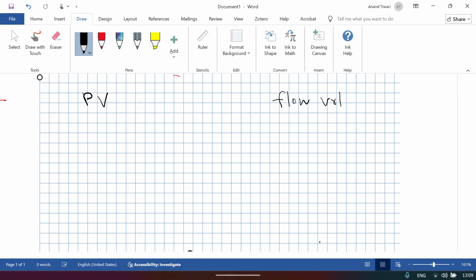Now in the pressure-volume loop, volume is on the y-axis and pressure on the x-axis. Anything which you see here, if you see a sharp fin appearance, or you see that there is a clockwise motion, it is related to spontaneous breathing effort. What I mean is a spontaneous trigger.